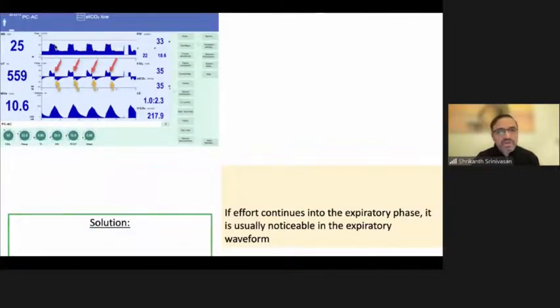You can see it's a pressure mode because obviously the plateau pressure is fixed. You can see that there is a flow graph and there's another spike in the flow graph, right here. This says that something has led to a change in the decelerating flow pattern, which normally should just come down gradually.